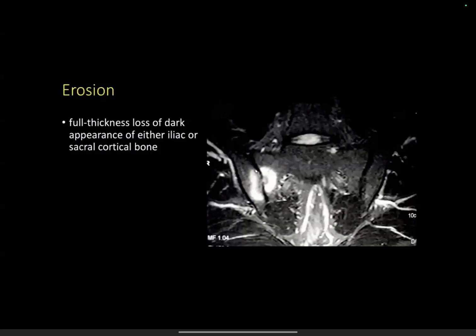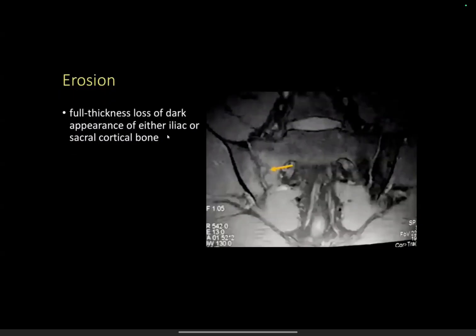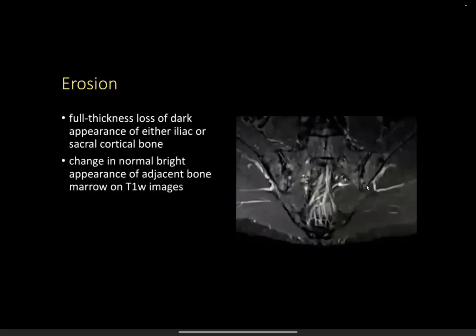So here the cortical bone, so not only is the joint space narrowing, but the cortical bone, you see, the medullary bone is grayish, the cortex appears pitch black, and here the interruption, the cortical bone also classically shows erosion, focal erosion, right? And there is significant subchondral edema also adjacent to that erosion. Again, here we are seeing full thickness loss, focal loss along the black contiguous line that we see in continuity in here on the left side.